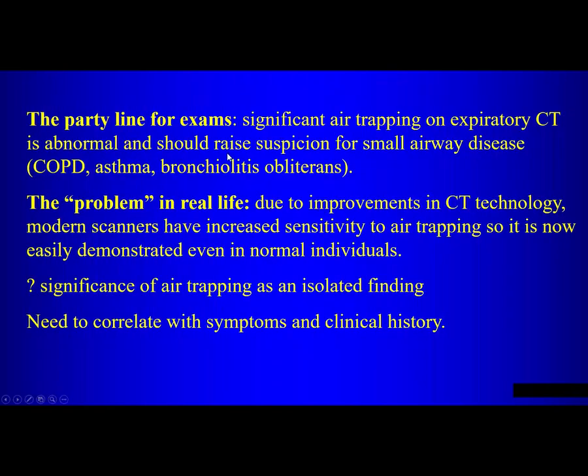So what does this mean? Well, for your exams, the party line, significant air trapping on expiratory CT is abnormal, and so think of small airway disease. So think about COPD, asthma, bronchiolitis obliterans, if you have air trapping on expiratory CT for your exam.